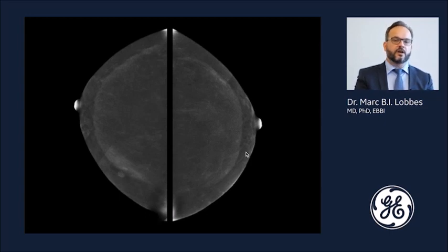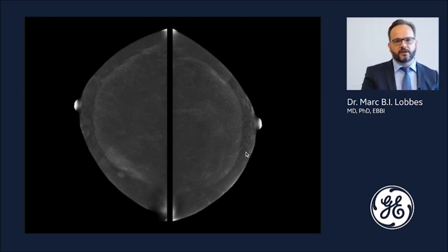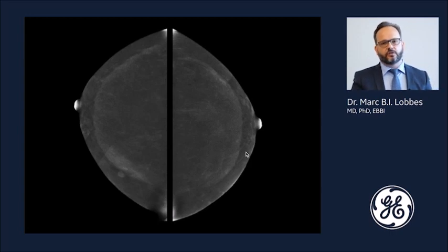So not all enhancing structures that you observe on a recombined image are suggestive of invasive breast cancer or DCIS. Some benign entities like fibroadenomas, hamartomas, papillomas are also known to cause some kind of enhancement and can be a cause of false positive findings in contrast enhanced mammography.